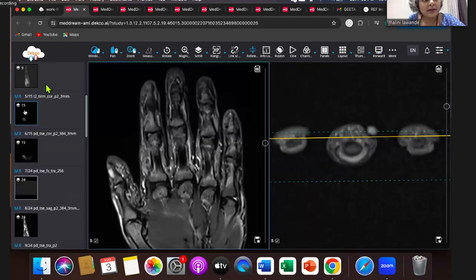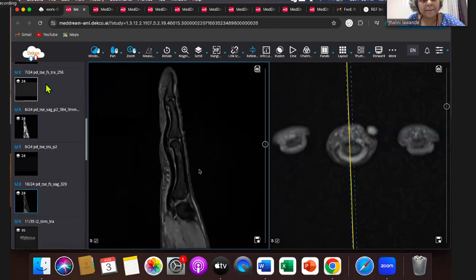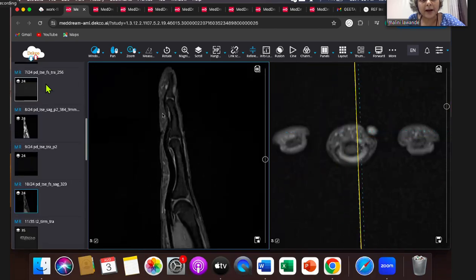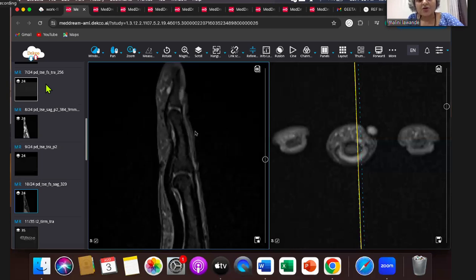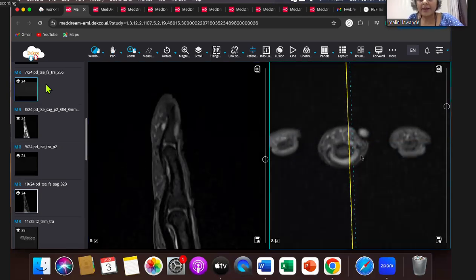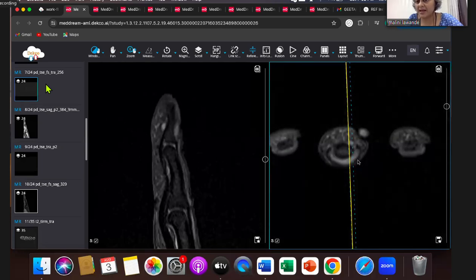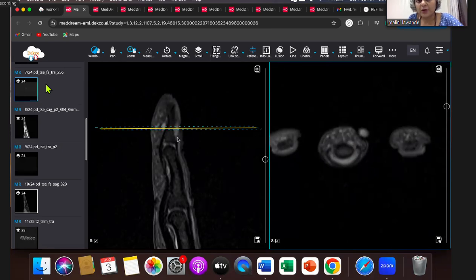And when I look at a sagittal image, can you see this? So usually these glomus tumors are dorsal, but it can be anywhere in the subungual region, this nail bed area. Even from this periphery, it can arise, glomangioma or glomus tumor. So can you see this? You need to look very carefully, and dynamic contrast or even ultrasound can help a lot. So glomus is another lesion.